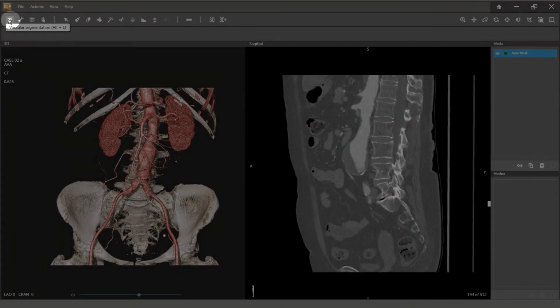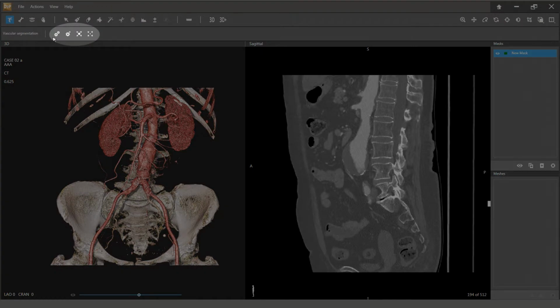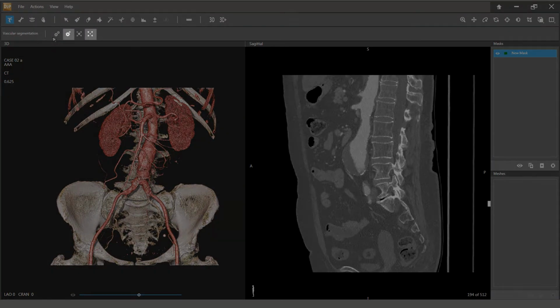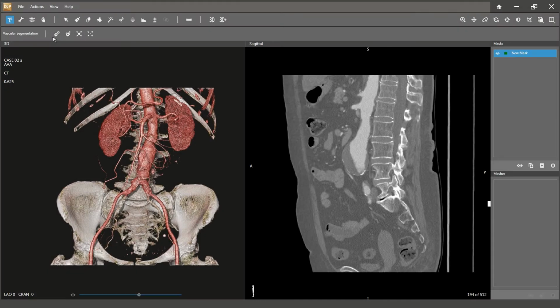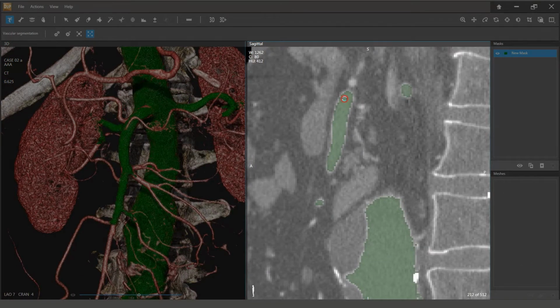Both normal and fine sensitivity modes are available for the automatic segmentation tool and for the semi-automatic path tracking tool. Use normal tools for vessels with a diameter greater than 14 pixels. Use fine mode for those with a diameter between 3 to 14 pixels. The following actions described for the normal mode may be used for the fine mode in the same way. You may work on either the 3D model or directly on the patient images.